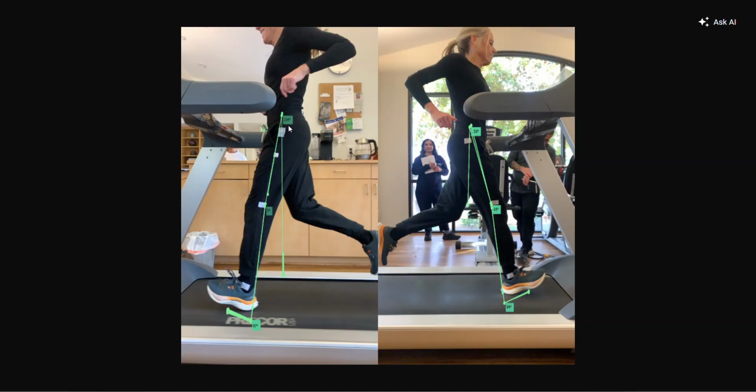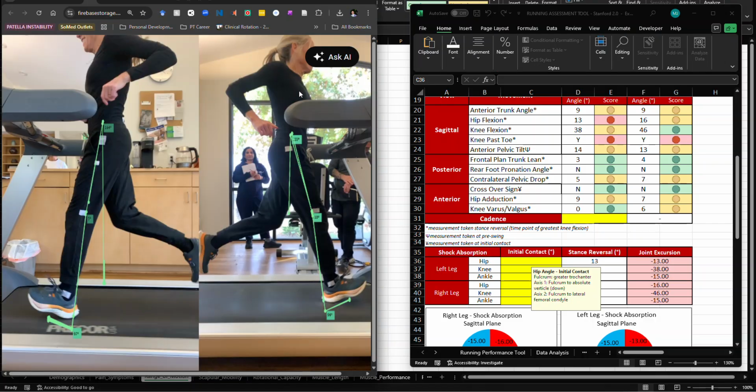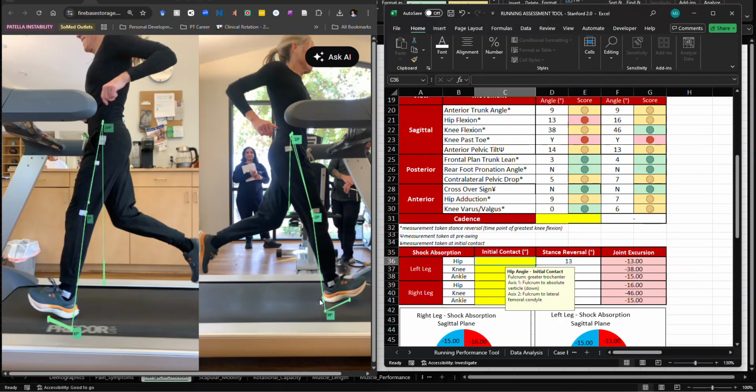So with the distortion that has come with the screenshots, historically I would probably use more of the snipping tool within my computer, rather than the screenshot feature built into the app itself, for the time being, because it seems like they have shifted, but the values are the same. So irrespective of that, let's start on the left.